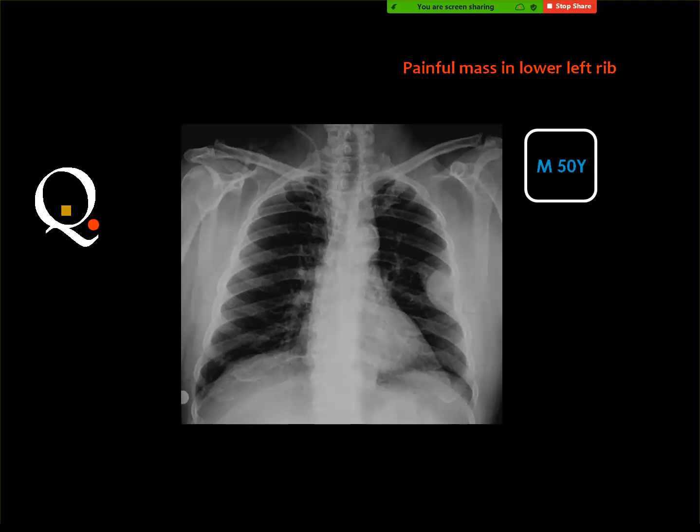Assalamu alaikum. Alaikum salam. Chest X-ray PA view. Yeah. Chest X-ray PA view showing focal lung lesion of an obtuse angle, oval shape, radio-opaque density based on the left lateral chest wall from inside, denoting that it could be originated from the pleura because it's obtuse angle with the surrounding lung parenchyma.